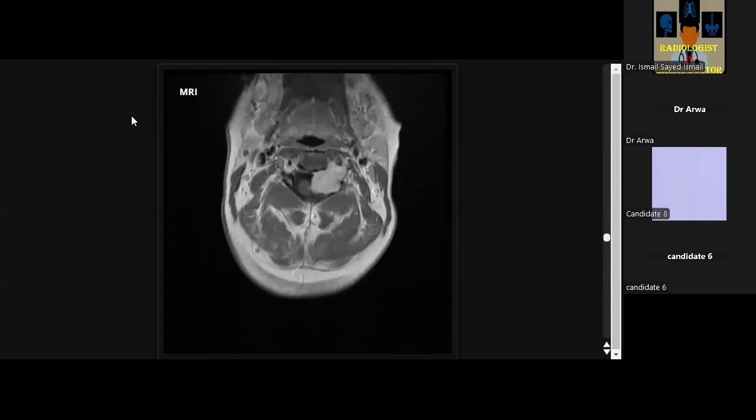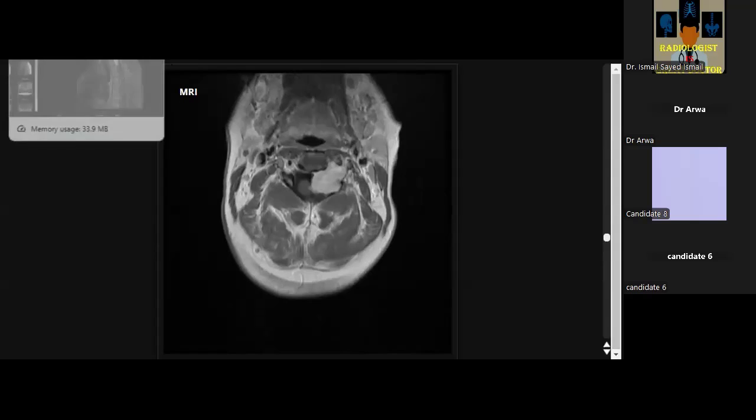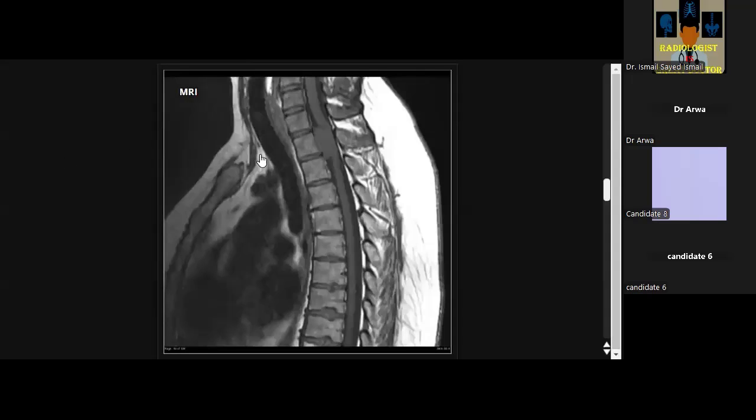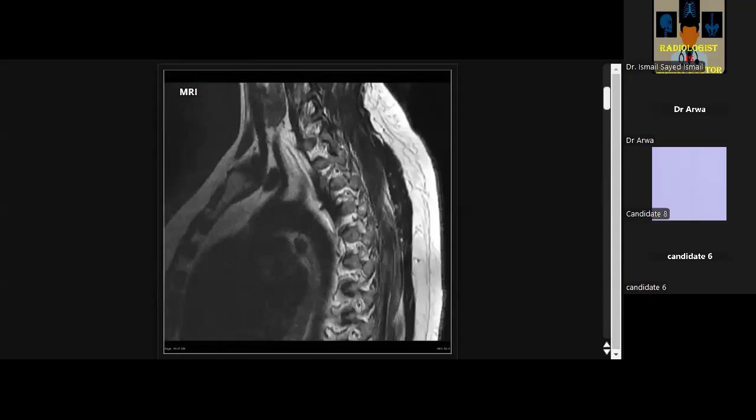So I will revise the two cases now. Please leave the mouse. Okay. So the two most common main differential diagnoses in the second compartment, the first compartment being intramedullary, the second compartment dural extramedullary: meningioma and schwannoma both will show a homogeneous enhancement, but meningioma most likely is iso in T1, iso in T2.